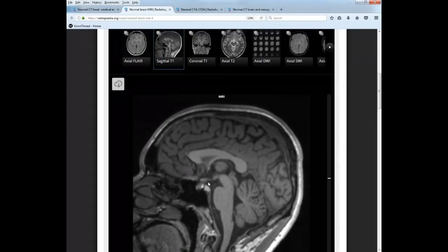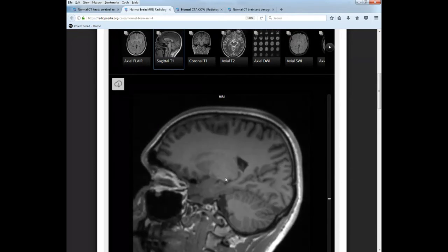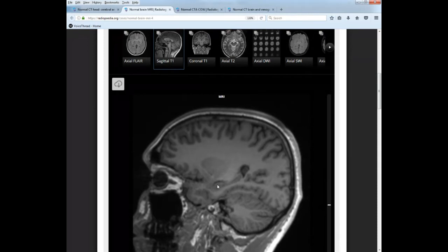And it's laid out right for you, and it's almost exact as long as you remember that the scan you're going to be looking at on the computer is not a 2D image, it's 3D. So if you can see the pituitary gland, the mammillary bodies, the thalamus, you have to go lateral to that either way in order to see the amygdala, right here.